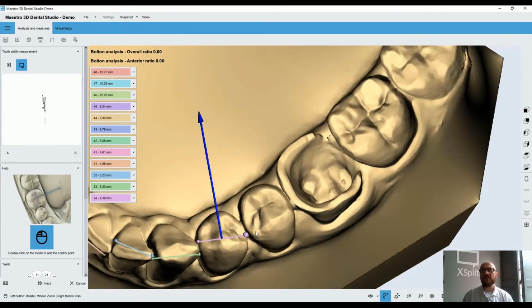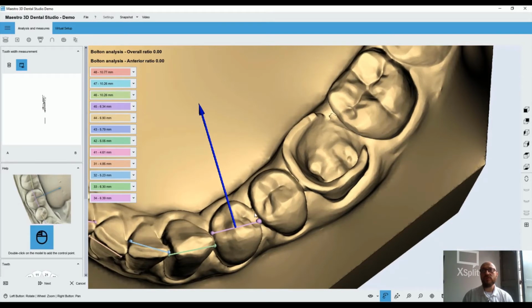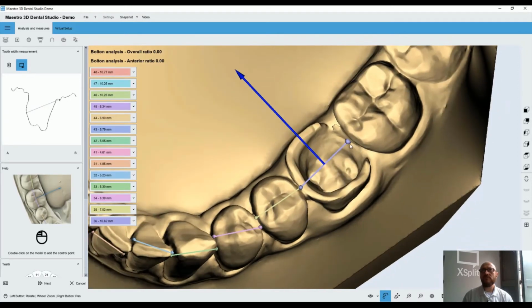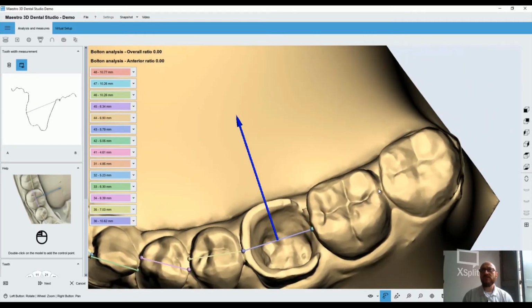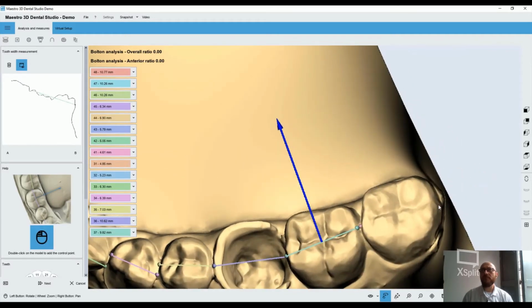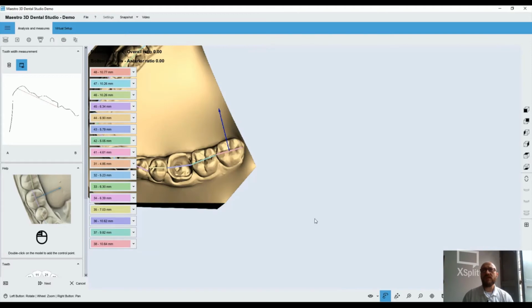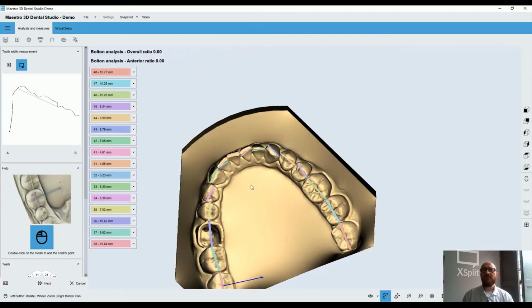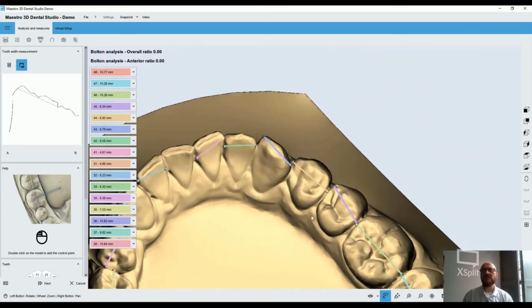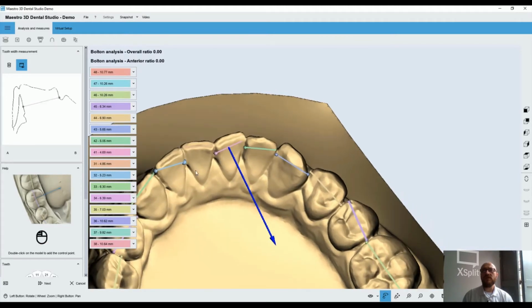But this is just a sample case for showing you what is possible to do and how it's possible to do. This and this, and the last one. Okay, done. Once done, I can fix some mistakes, as I did in this way, and so on.